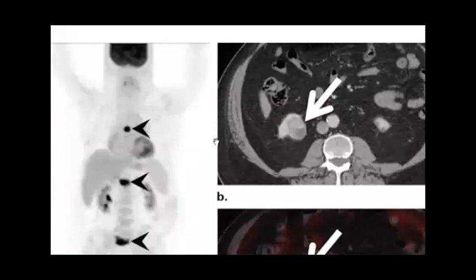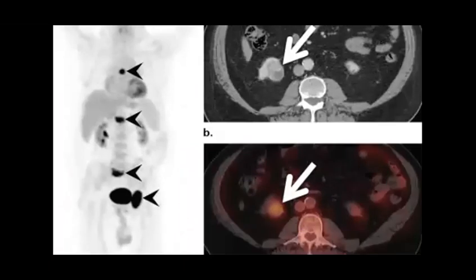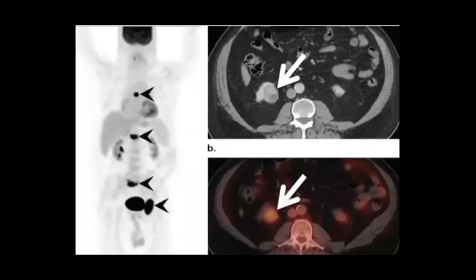Then let's have this one, which is a good case. And I hope everyone is enjoying this type of problem-solving case. So any focal lesion in the... perfect. So try to fix to your rules.